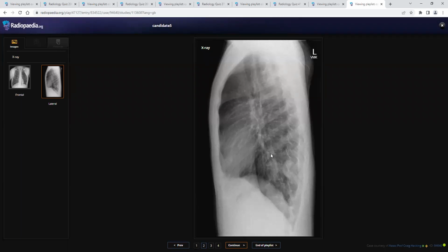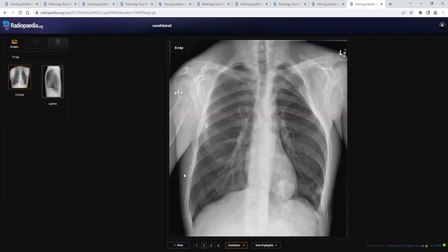So what are your differential diagnoses? So in this patient, where I could see multiple other lesions which were related to the ribs, and there is this rounded lesion related to the vertebra, and this patient has presented with thigh pain, a possibility would be multiple osteochondromas.